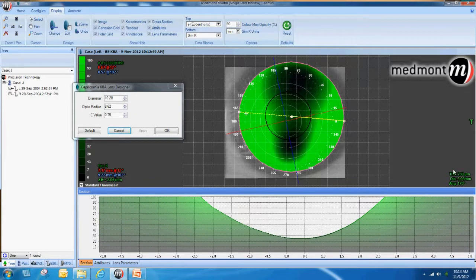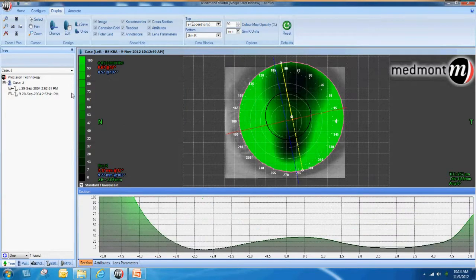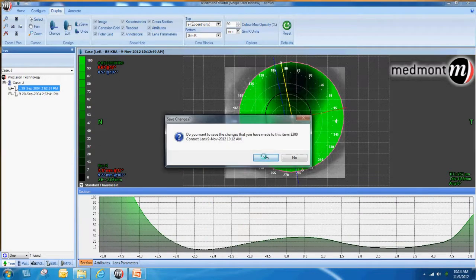If we click our cursor on this point, there is 230 microns of fluid on the nasal side. On the temporal side, 257 microns. And that's observable on the graph down below, where the amount of fluid underneath the contact lens across this horizontal meridian is excessive. And this would cause lateral displacement of the lens. Bubbles form above 90 microns, and we have over 200 microns on both nasal and temporal sides. So this lens clearly would struggle to be centered, and the patient would struggle to find comfort. So therefore, let's fit this patient with a scleral lens.